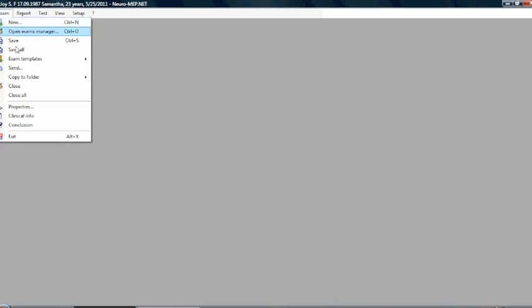So one thing you're going to have to decide early on is if you want to work with templates or if you want to work with nerves, as you decide which one you want to do, or muscles. Let me explain briefly what a template is. Basically, let's go here under exam and say exam templates. When we send you the machine, it's going to come with preset templates for upper extremity conductions, lower extremity conductions, upper extremity EMG, lower extremity EMG. Let me explain what that means.